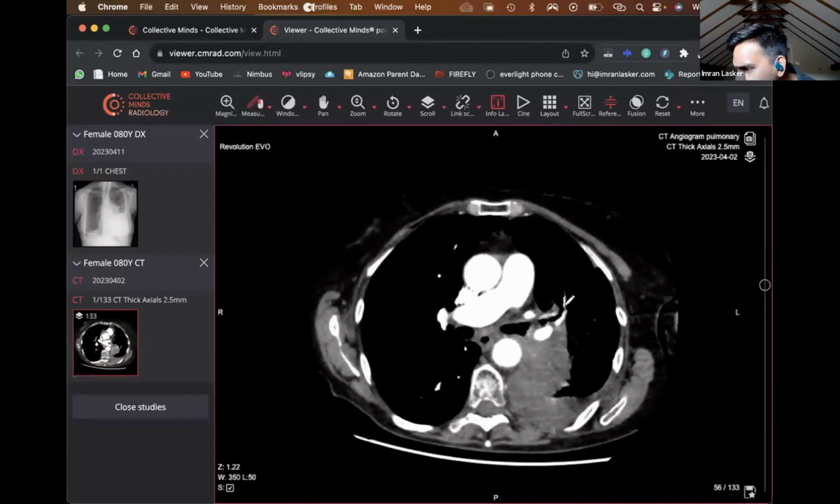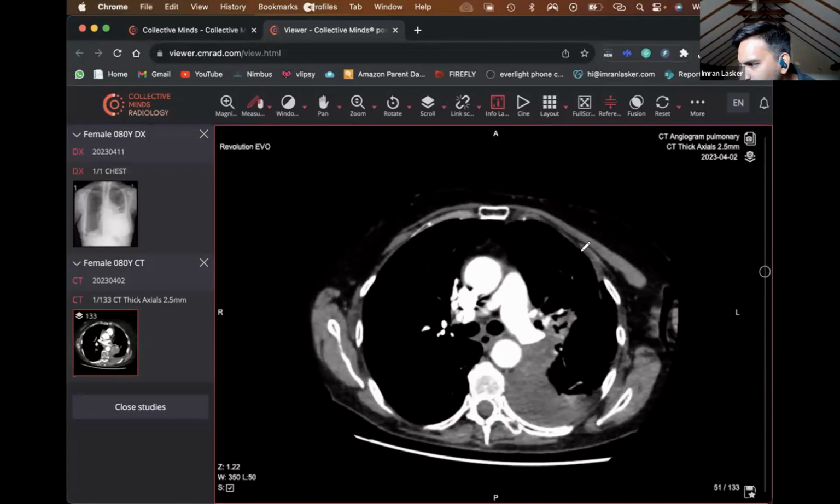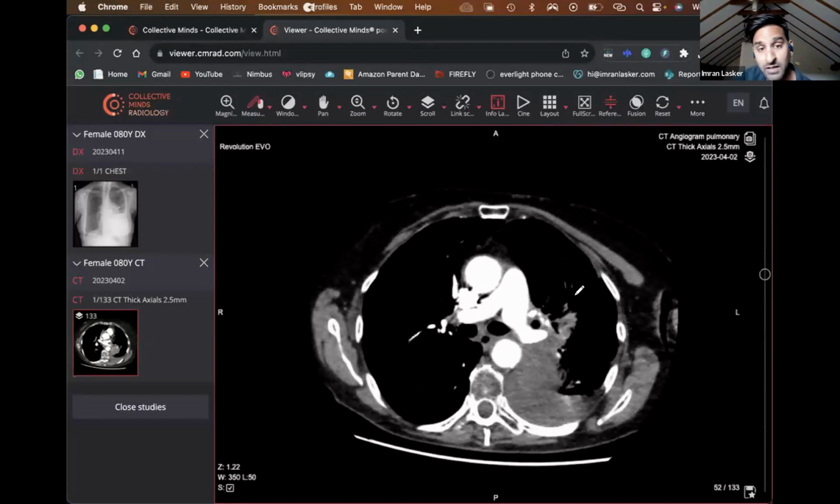You've got to look at these arteries and see, look, that's going to be a vein, that's going to be artery, that's going to be artery. I mean, you could potentially say there's going to be a tiny one in that area there. That's potentially possible. Oh yeah, by the way to do that is that you look at this, right?